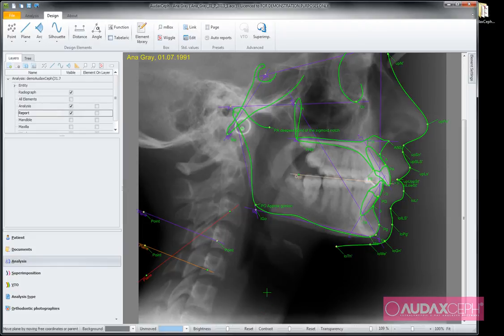Now I created another plane, and I'm going to make a point on the cross section of last 2 points, and if I move that first point around, you can see that the cross-section point will always remain on the cross-section, even outside of the plane, because it goes very far, you know.